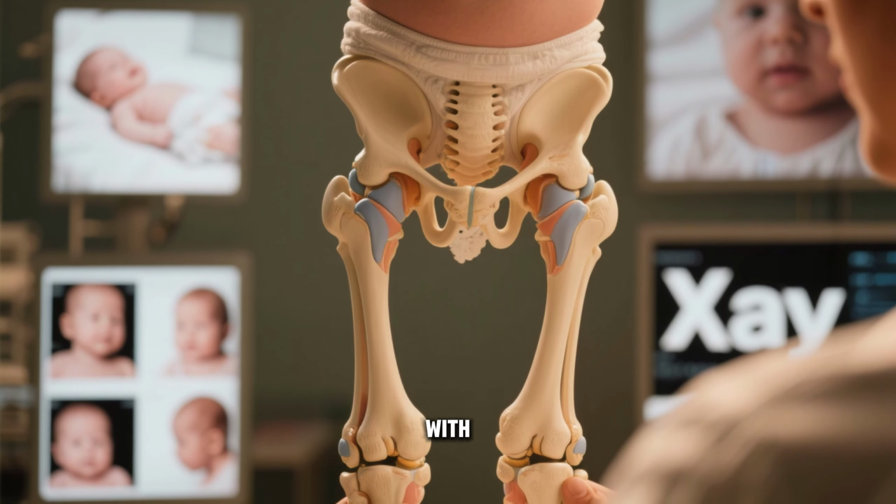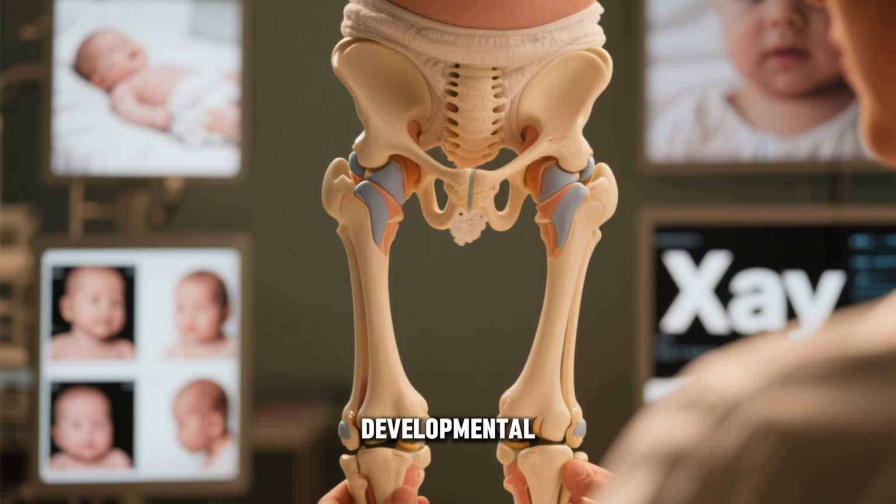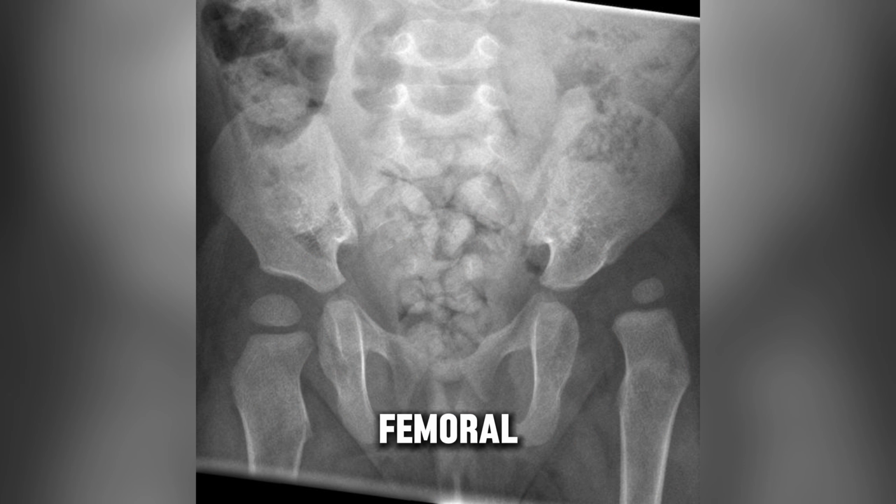Here are some cases with examples on X-ray showing developmental hip dysplasia. The femoral epiphysis here in this case is smaller on the left and there is an underdeveloped, shallow left acetabulum. The femoral head is laterally decentered and is almost certainly fully dislocated. Features are of developmental dysplasia of the hip.